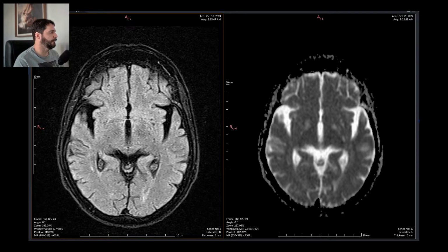So it's described just like we said earlier. And let's just summarize this. This should be a quite difficult tumor to access. To do surgery, I suppose it's nearly impossible to remove.